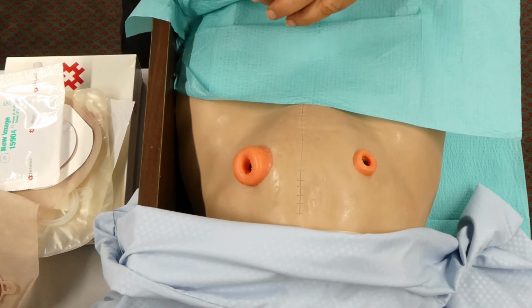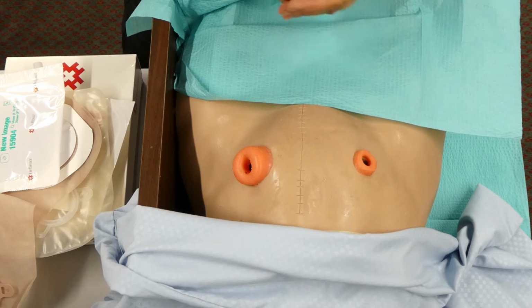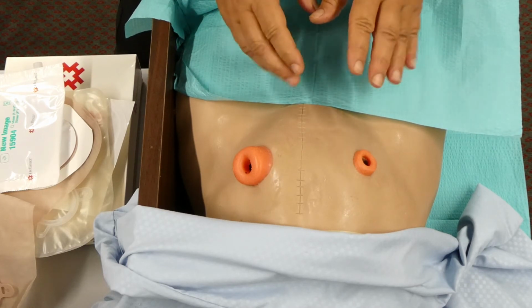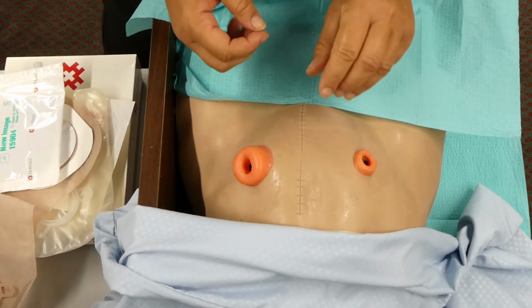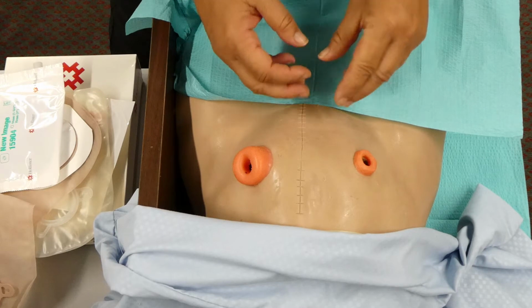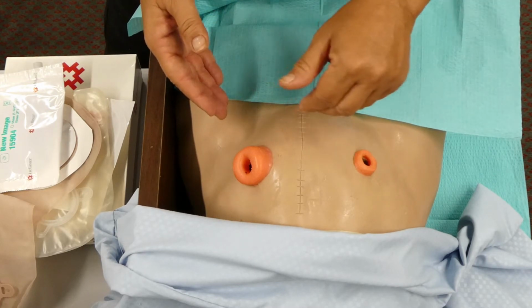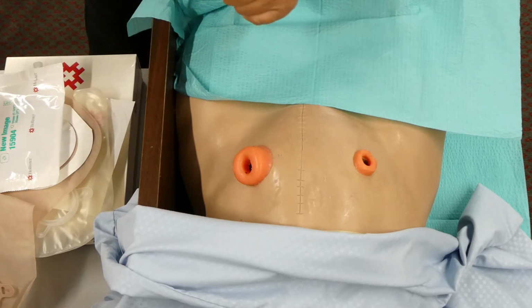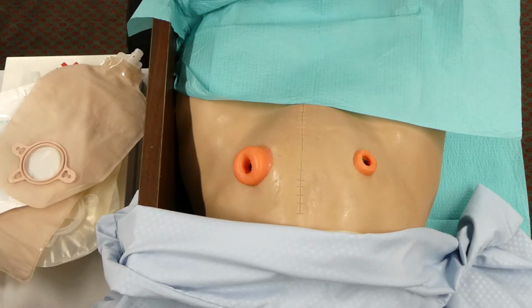If they have a great deal of the bowel removed, possibly in the ascending colon, the fecal matter is going to be rather loose, and it's going to get less loose, more formed as it goes through the transverse colon and then finally into the descending colon. Okay? Now, there are different types of devices.